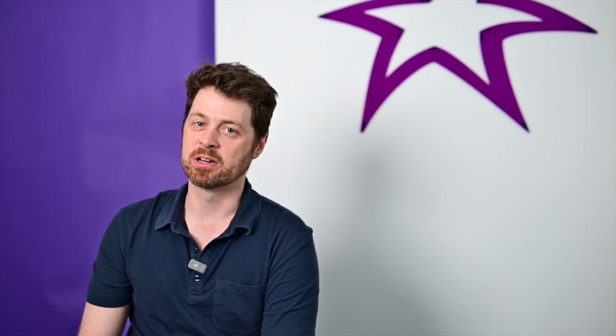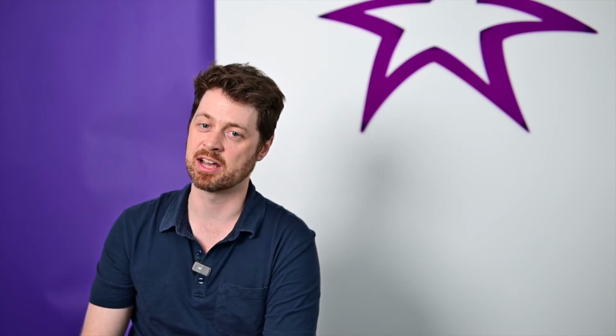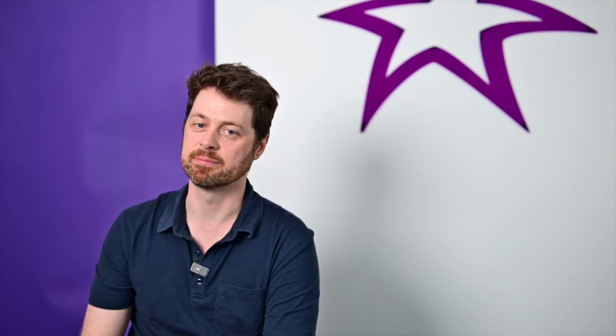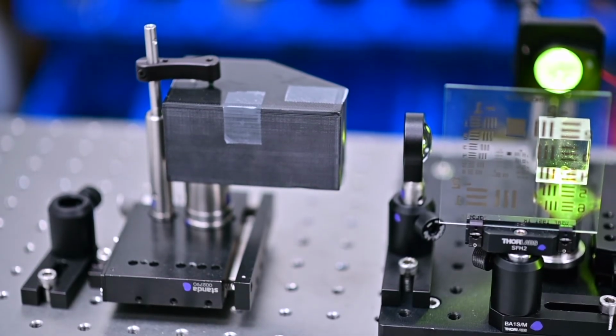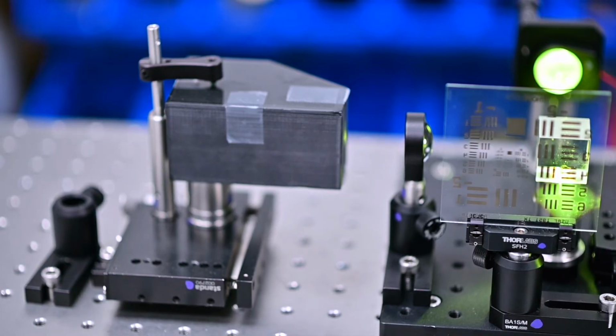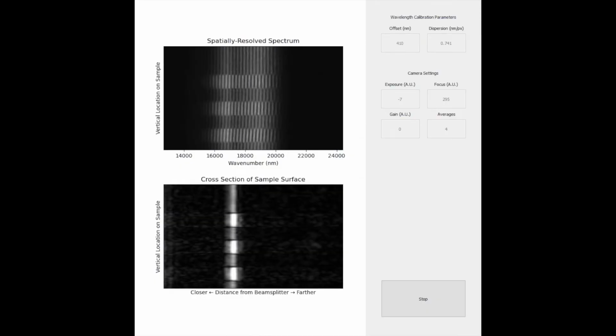Electrical engineers will be familiar with the inherent relationship between signals measured in time, such as, in this case, the time of flight of light traveling along a certain path, and signals measured in frequency. By replacing the camera in our setup by an inexpensive home-built spectrometer that has some rudimentary imaging capability, we can simultaneously measure the frequency spectrum of recombined light from many adjacent points over an imaged line. Interference is observed in the spatially resolved spectrum, which is used to infer the distance of the sample surface relative to the reference mirror, as well as to generate a low-fidelity cross-sectional image of the sample.